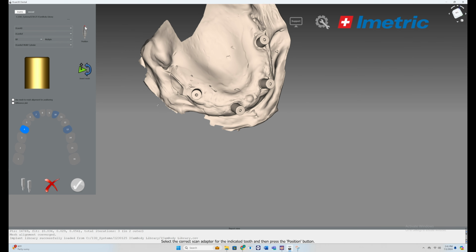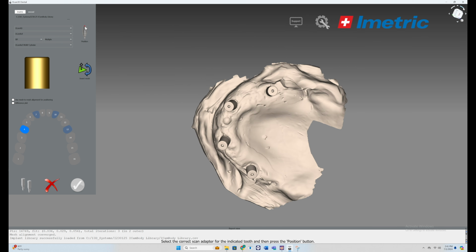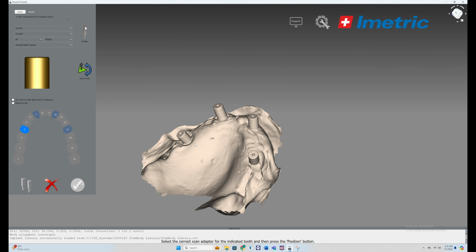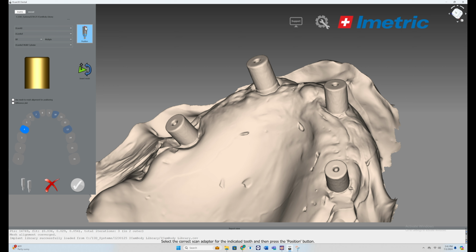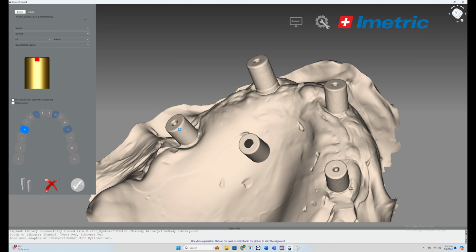Once you've made sure that these match, the next thing that we're going to click is the position right there. And so once we click that position, it's going to give us a red click center along that healing cap that indicates where we want to click to align. Now this is going to be a little different based on each specific healing cap. So looking at that click center, we're going to go ahead and click around that area on that healing cap. For this instance, what we're looking for is a speckling of yellow across that healing cap.